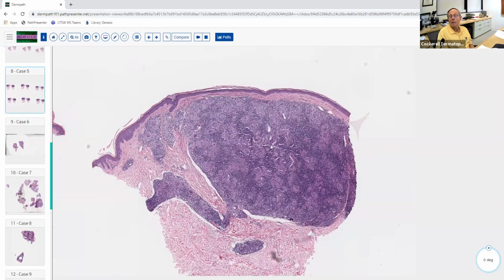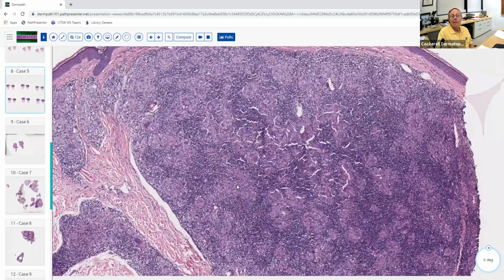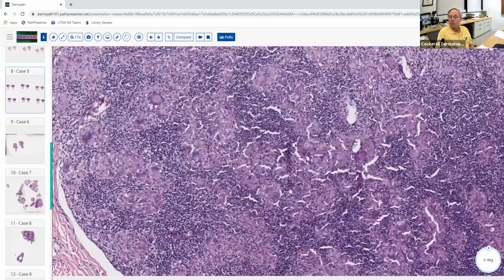So basically what I would want you to say is, well, if they look lighter and it's an inflammatory process, they may be histiocytes. And I'm not expecting you to say they're definitely histiocytes at low magnification. We said they might be. So we're going to higher magnification. We're going to see if we can confirm that. And indeed, we can, right?